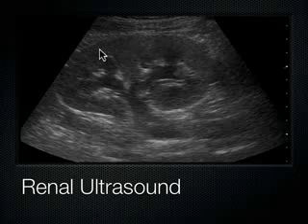This is where all the nephrons are, and the nephrons take the blood that's coming into the kidney through the renal artery, they filter it, and they send the blood back to the rest of the body through the renal vein, and they filter out the urine and put it here in this pyramid. And so you've got the cortex, then you've got the pyramids, and in the pyramids they look basically black or anechoic because they're full of fluid or urine, and that's why they look black.